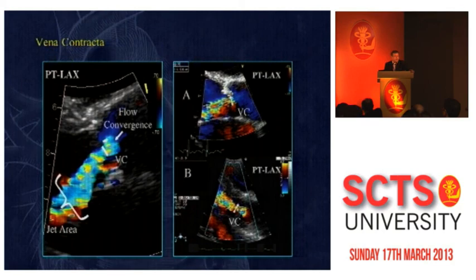And particularly when you encode velocity in color, you're limited by what we call a Nyquist limit. At this level, you cannot evaluate the velocities anymore, and in color, the color will change from, for example, blue to red, or from red to blue. At this very level, you have the velocity that is being shown. It's shown here on the scale by the machine. This is the velocity at which the color will change from one color encoding to the other.